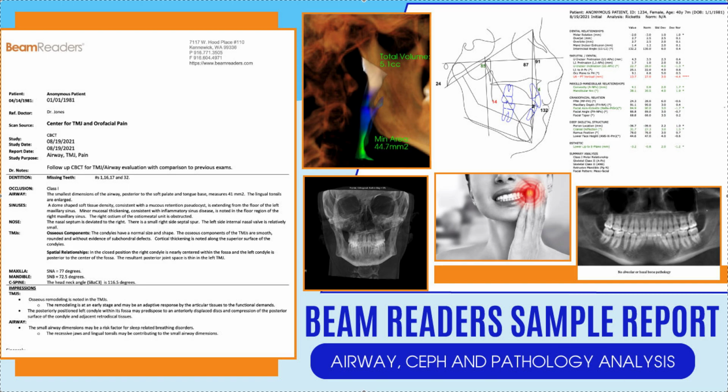So this is the sample I got from Beam Readers. They definitely told me if they get more anonymous samples that they will send them to me and I can make more content. But for now, this is all I have.